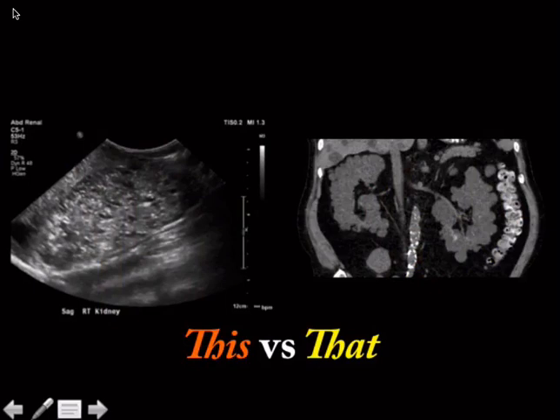Okay, so coronal view through the kidney here. And remember I said kidneys, biliary system, spleen. It's obviously a kidney pathology question. They're enlarged, right? Big kidneys, lots of cysts. So we know this is adult polycystic. We can also see the cyst in the liver, just like our cartoon case.